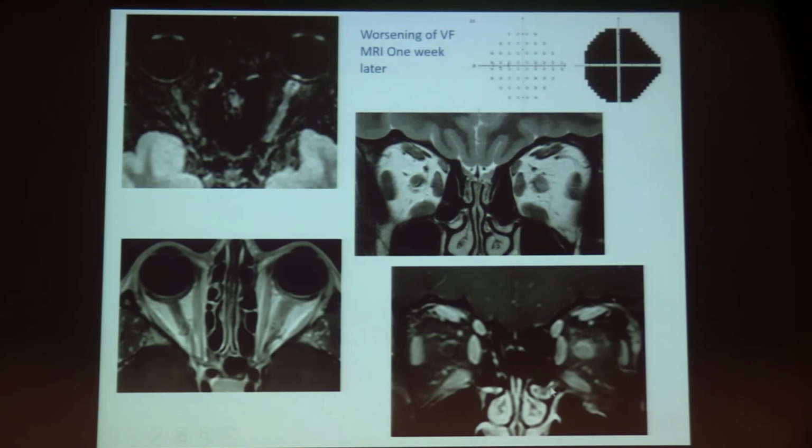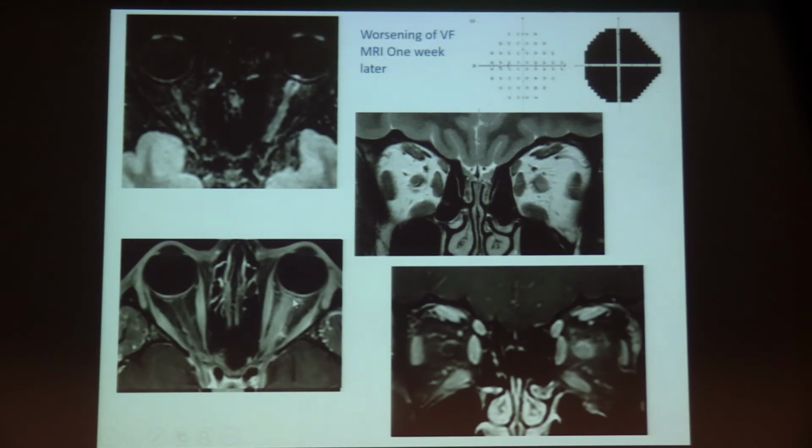It is high signal. The contrast enhancement is very well seen. And on the Dixon image, why is it important to use fat suppression after injection? Because if you don't use fat suppression, it is very difficult to see the enhancement. And when I use fat suppression, I see very well the complete contrast enhancement of the complete nerve, and it is an NMO with an anti-MOG positive.